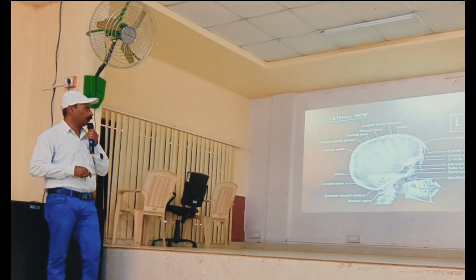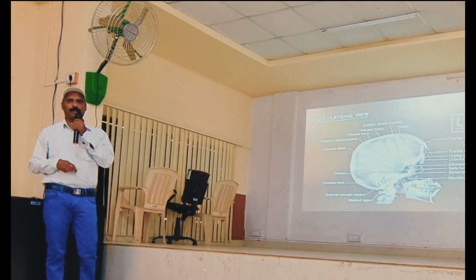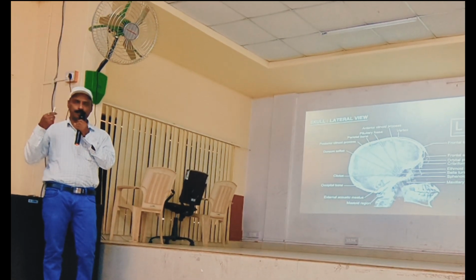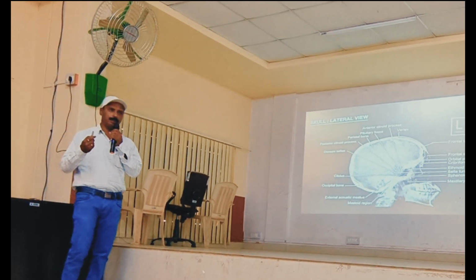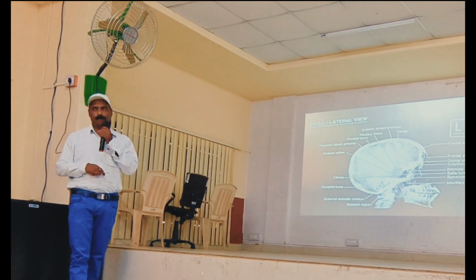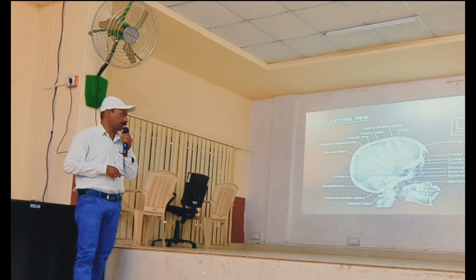These all things you have to see, all the parts where you can study in the skull. So in the different normas we have studied the skull. In different normas, if the skull X-rays are taken, you should be able to identify the different norma structures. So that is the one which is norma lateralis. This is one skull which we are going to study.